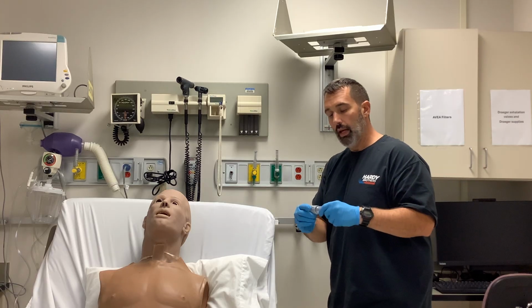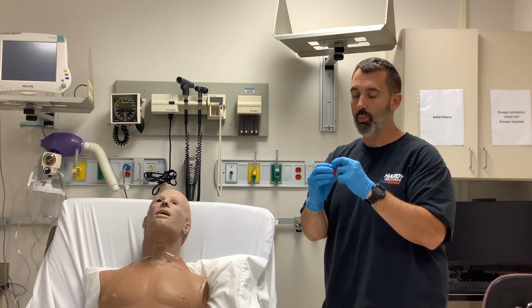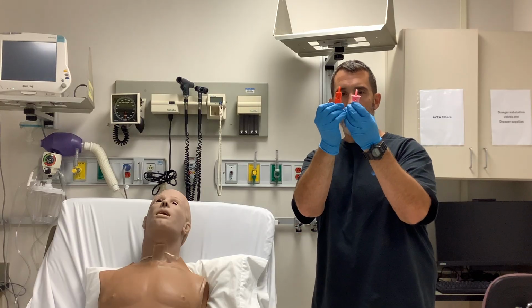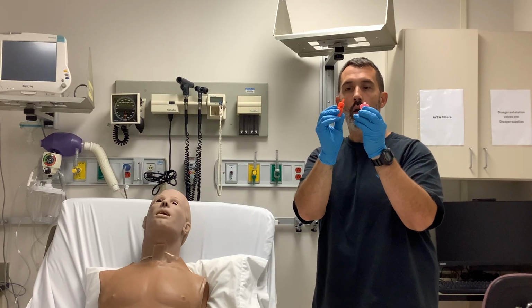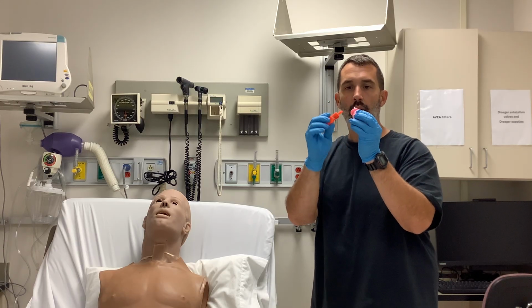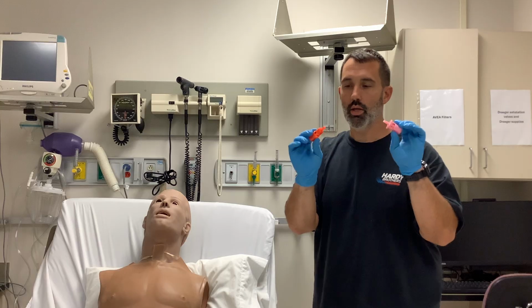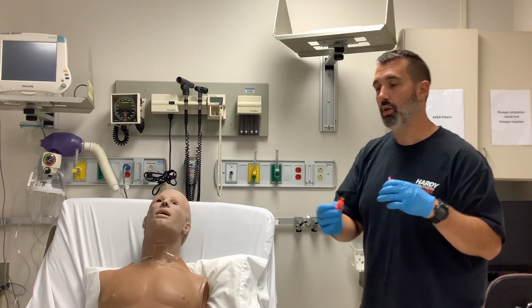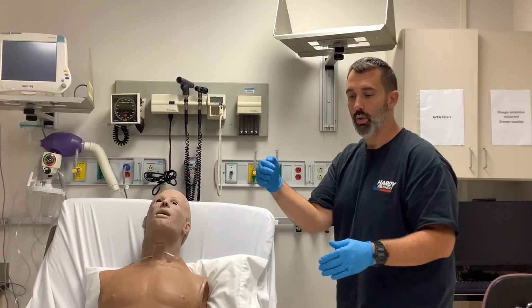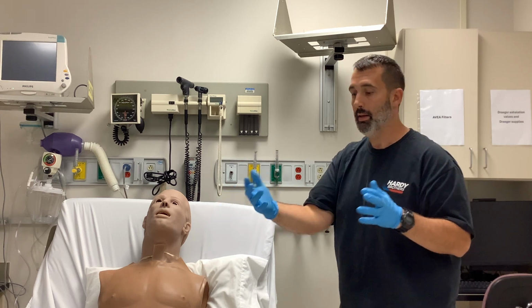So, and it's the same scenario, just if you happen to have different devices. So this happens to be a 40% Venturi, this happens to be 50%. So the actual entrainment windows, there's not a significant difference. 40% is going to allow more air in because it's got to be diluted down, so there's a little bit more openness here. And it also tells you to adjust your liter flow to like 8 liters per minute. Both of these say to adjust to 8 liters per minute. And that's where the knowledge of your air entrainment ratio stuff is going to come in. So like we said, you've got to have room air or 21% mixed with 100% to give you any type of percentage in between 100% and 21%.